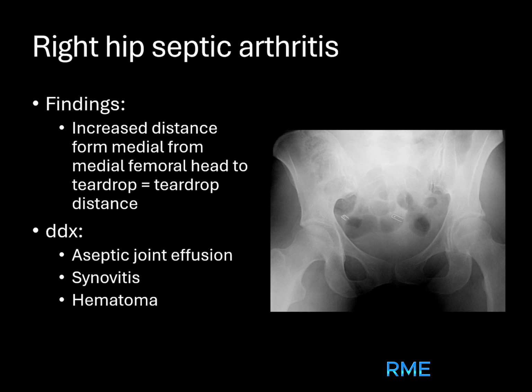To further evaluate, an ultrasound-guided aspiration of the joint fluid is necessary to confirm the diagnosis and identify the causative organism. Management involves intravenous antibiotics and possibly surgical drainage if there is no response to medical treatment. Let's move to the next case.